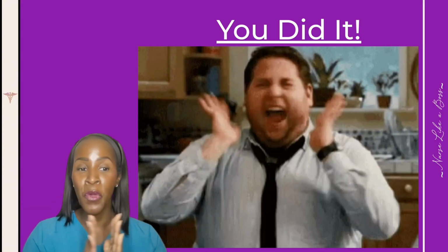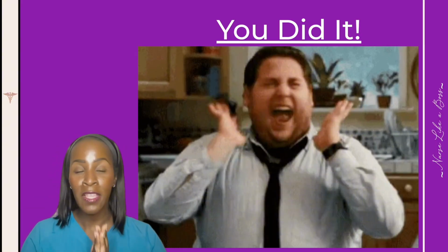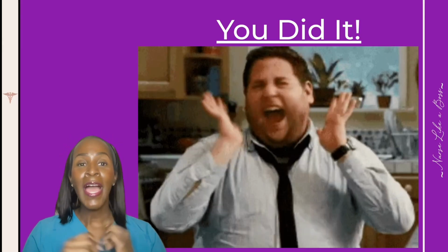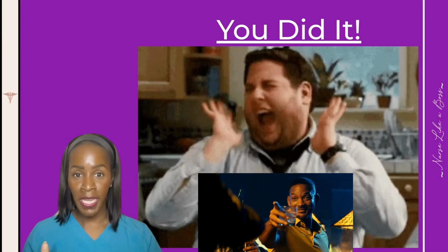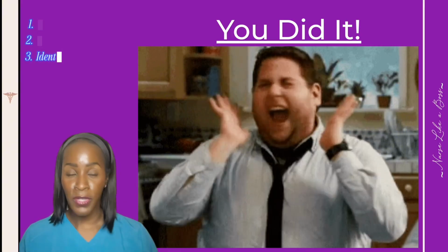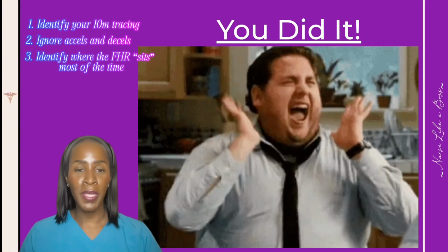You now know how to find your baby's fetal heart rate baseline. Congratulate yourself. I know it was a little tough, but you did it. Let me know if you have any questions down below. Make sure you write down these 3 steps, take them with you, and you'll be golden.